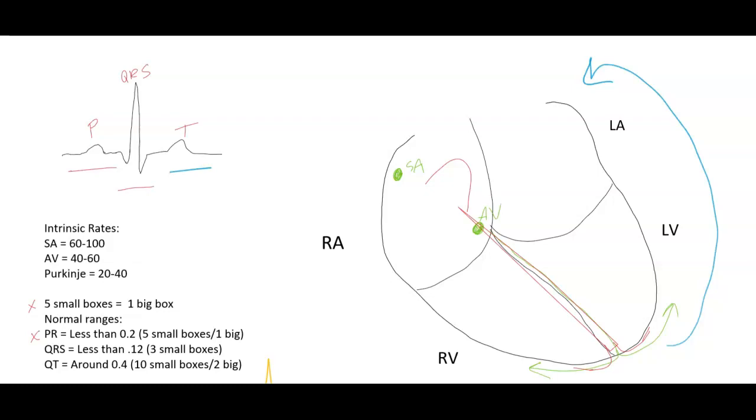And with that, we'll throw one here. So we're looking at the AFib, a common heart arrhythmia that nursing students are usually going to see. As we can see, there aren't really any pretty little P waves. So we know that this SA to AV node, which usually likes to cause that cute little jump, so to speak, isn't really happening so much.